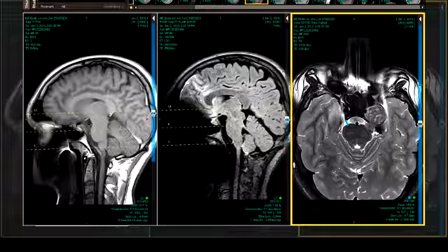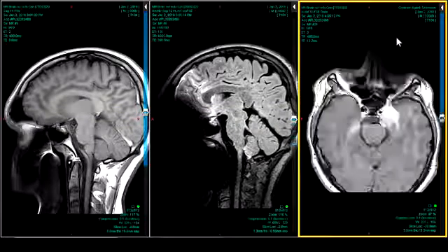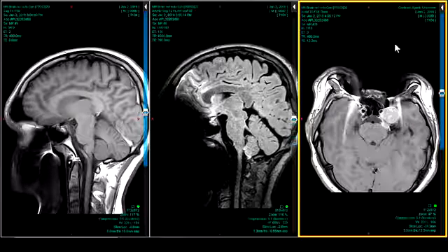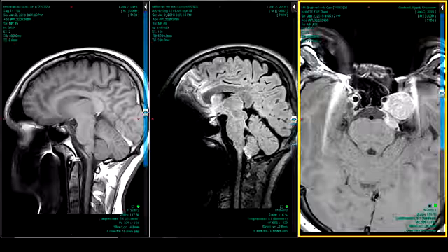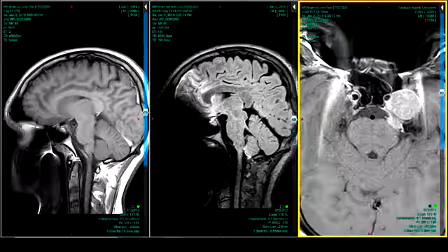Look at series 31, image 7. I was going to see what you thought about that. Is that the 7th nerve right there next to it? I don't know. That little dot there, is that the 7th nerve? Or 6th nerve? 6th nerve. I was wondering if that was where the 6th is getting involved. That's the 6th nerve, and here's the 6th nerve on the other side, that little nipple right there. Right, I think you're right.